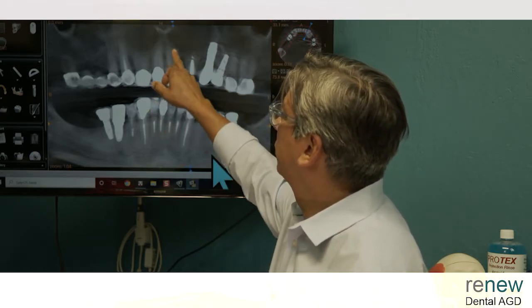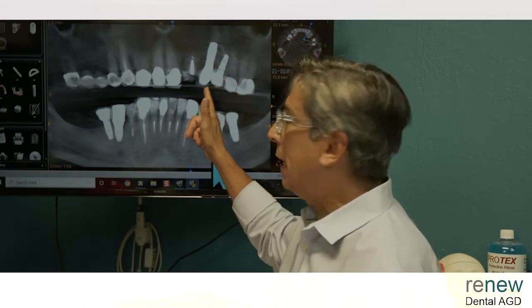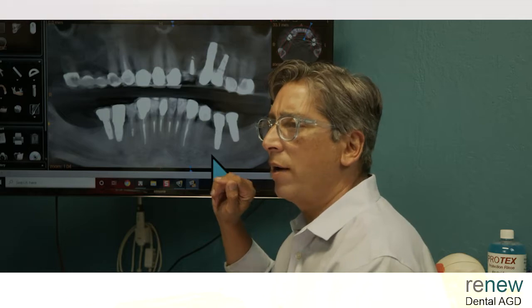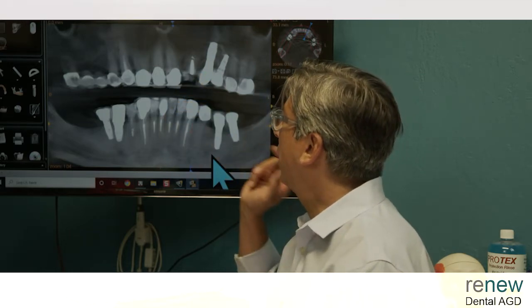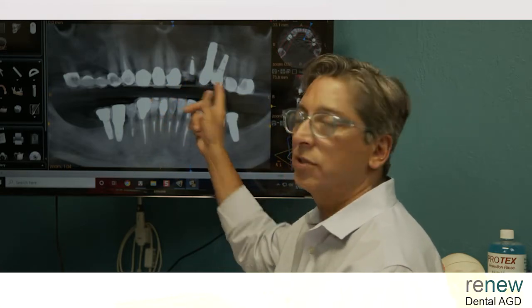Intuitively it seems like a thing you don't want to do, because this ligament has a little movement, teeth have to move, and this does not, so you don't want to put undue biomechanical stress on this. Well, why don't you put a softer cement? Use a temporary cement here and use a real cement there. So if anything's going to give, it'll be the cement here.